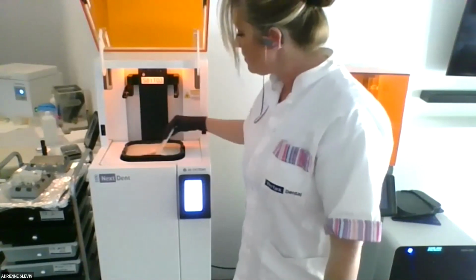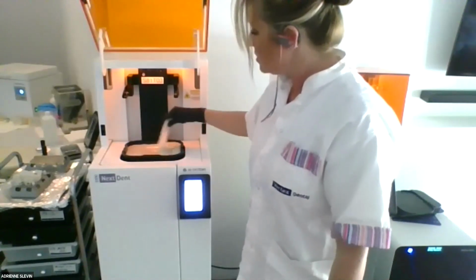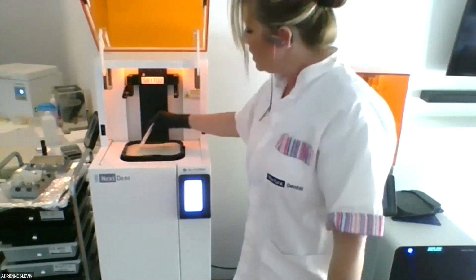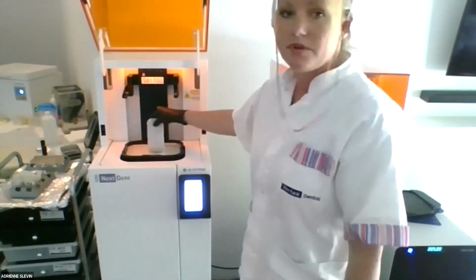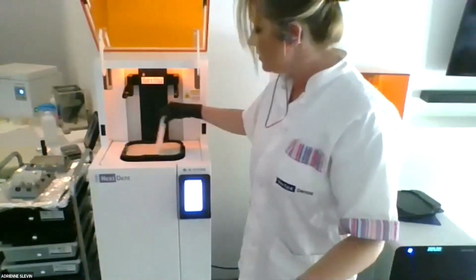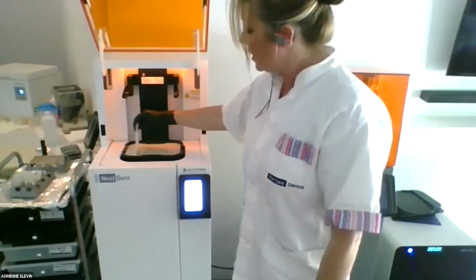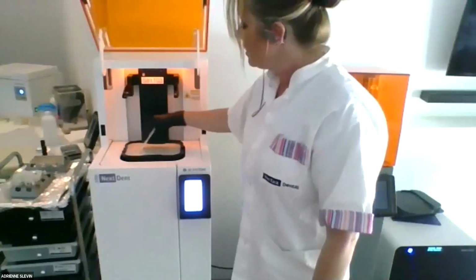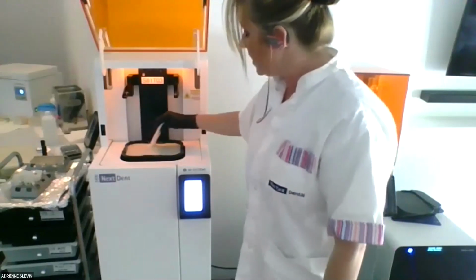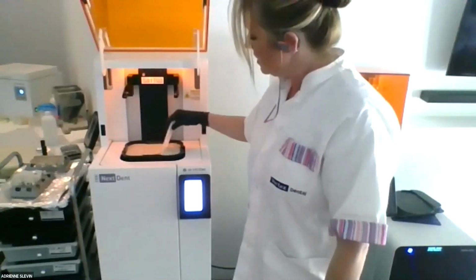And if you do want to use more materials, more variety, because we have a ton of them, you can actually clean out your tray within about 2 minutes. I have a video on YouTube showing you how to do that, and we have a user manual as well. But you can use 1 tray for every material if you want. I prefer to have a couple of trays. This way I don't have to clean my tray, and I have the material ready to use.